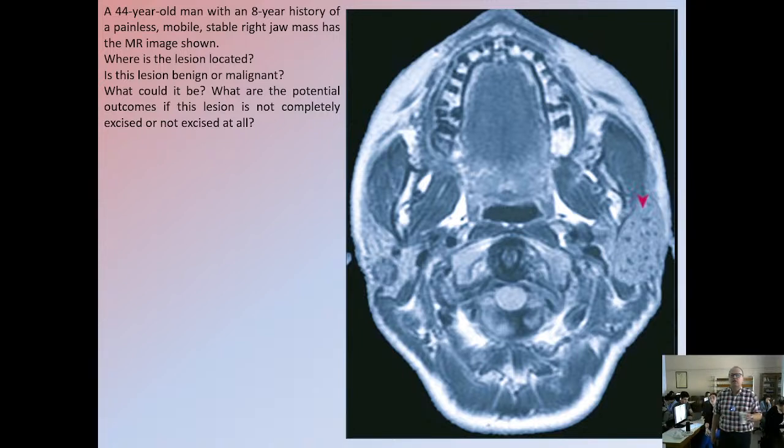Having a look at this tumor, it's quite big. Have a look at its consistency. It's not uniform. There are some areas within the tumor parenchyma that give a different signal. However, it is rather well demarcated. So it's probably benign. It's a tumor, I think, of the parotid here.